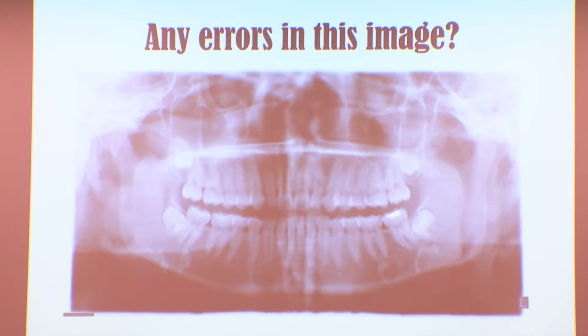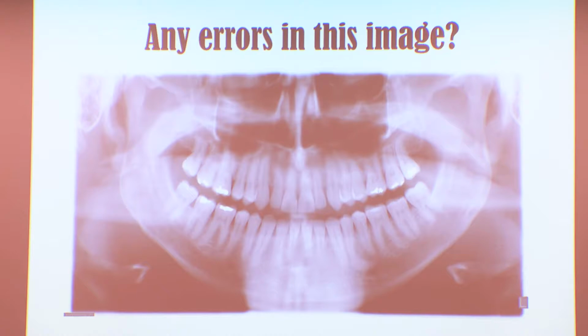This one here. Yep, the chin was up just a little bit too much. And then this right here, you might think that that's some pathology, but that's actually the hyoid overlapping onto the mandible. Slumped, yep, slumped, and the patient's chin was too far down. So you can see that the condyles are starting to get clipped off on the top here. So what you would do is bring your patient's chin back up just a little bit.